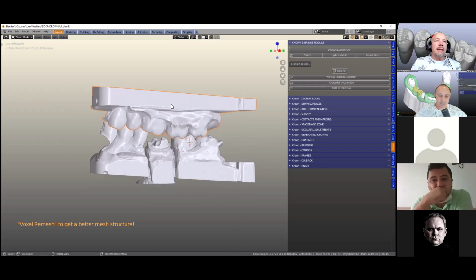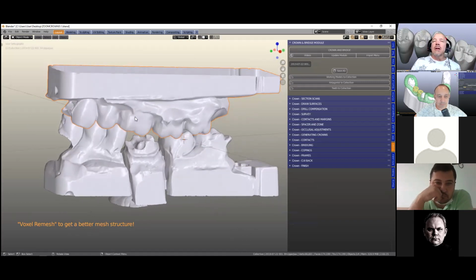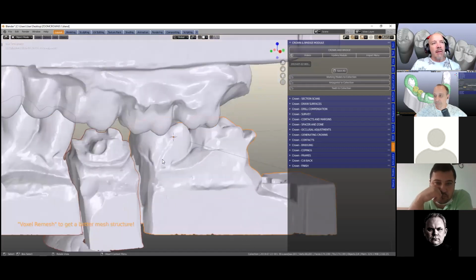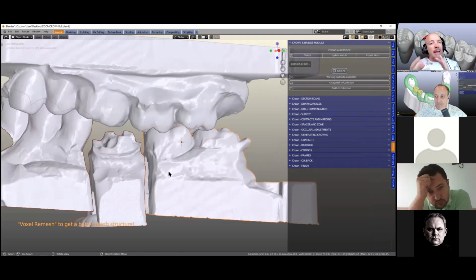So with the antagonist, I'm going to do a crown with an antagonist, one tooth only, and just demonstrate how this works. We're going to chuck in the working model, which is these three. They are separated. If they're not separated, they can be separated by making a die in the model designer, or we can make a vertex cut.